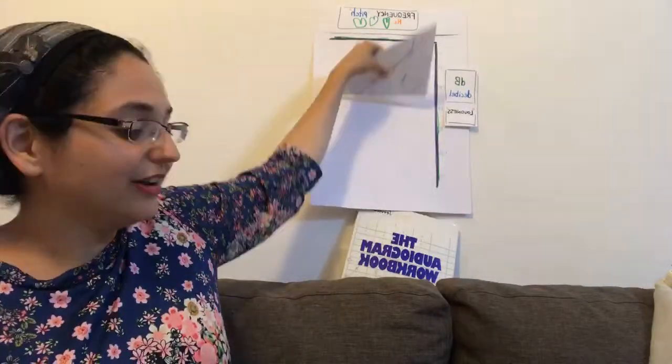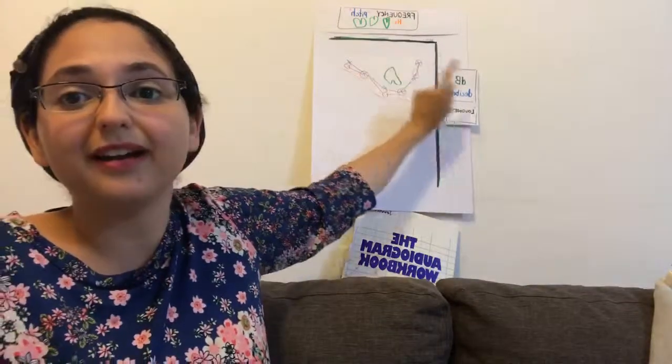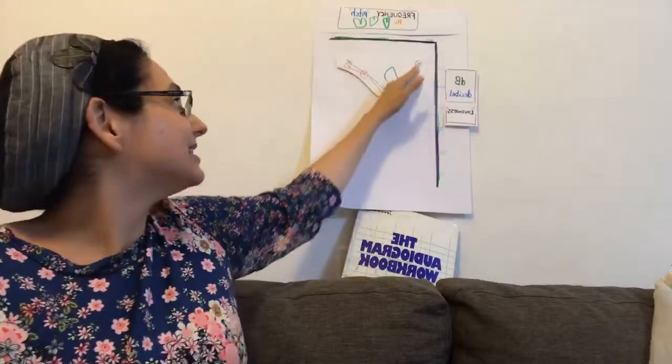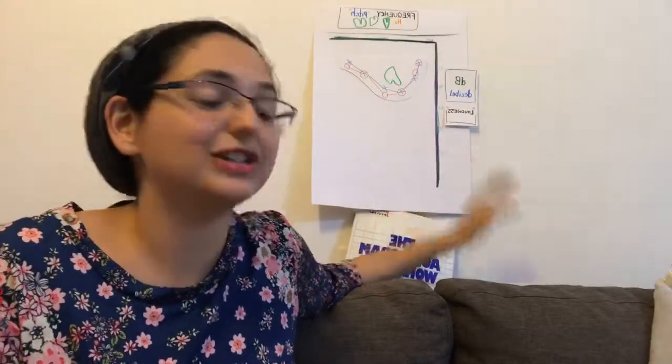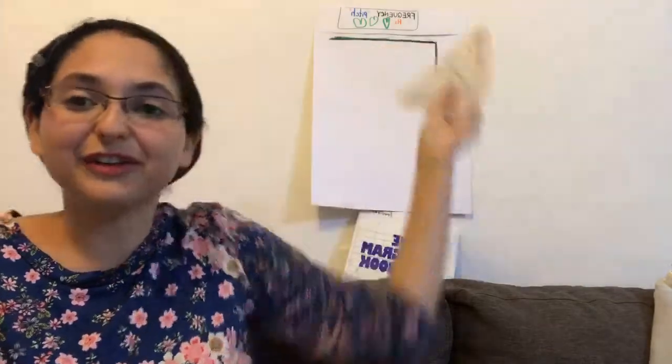And we also have another configuration, so how it looks. The other configuration is a cookie bite, which looks something like this, where you have normal hearing in the low frequencies, normal hearing in the high frequencies, and some hearing loss dipping in the middle. The cookie bite configuration is sometimes seen with hearing losses that are due to genetic mutations or things that are hereditary and congenital, so from birth and running in the family. This is less common when hearing loss develops later in life. So those are the different configurations.